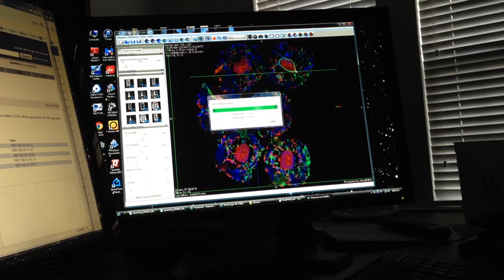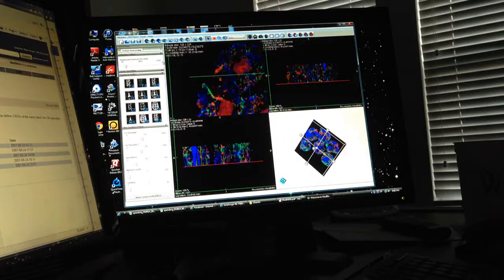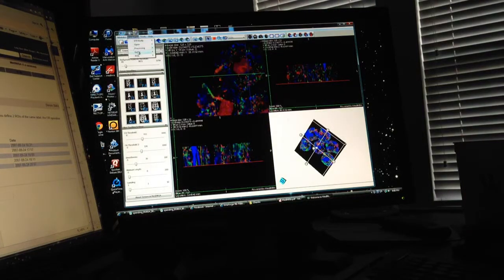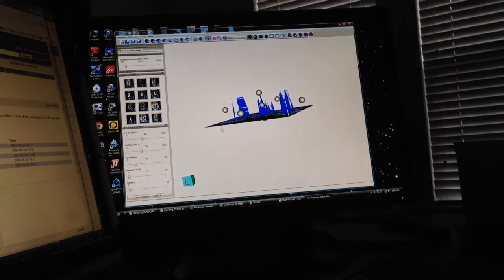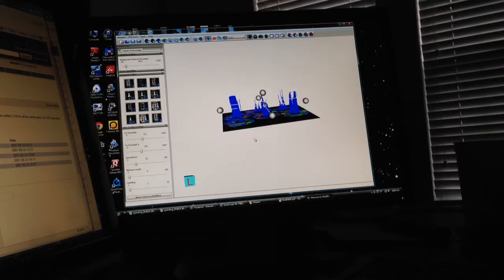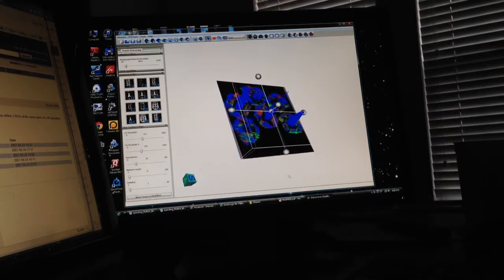Alright, almost there. Alright, so now I'm going to go up here under DTI Track, upper left hand corner, Views, 3D full screen. You have to do it twice for some reason. Maybe I'm missing something. But anyway, in theory, what we have now is the blue fibers, which is what we're interested in, of the spinal cord, for those 6 regions of interest that we drew.